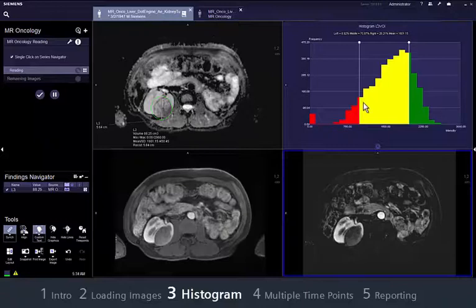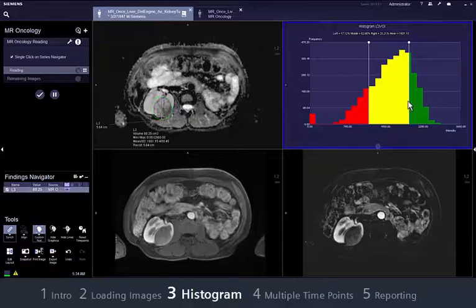In the histogram segment, 2 sliders are set by default, using your last OncoCare settings, defining 3 histogram areas. The proportion of each is displayed. You can move the sliders to define the appropriate areas, for example, to determine which tissue parts you want to highlight based on your experience.